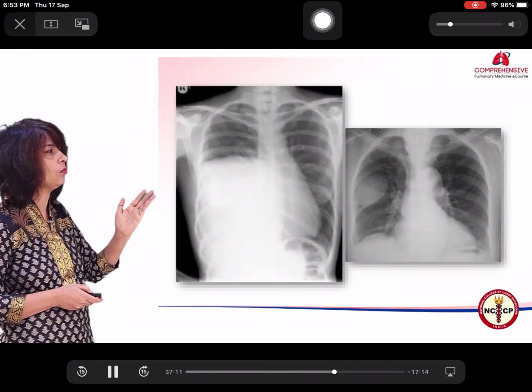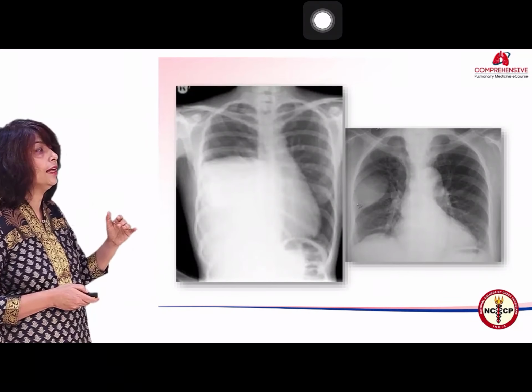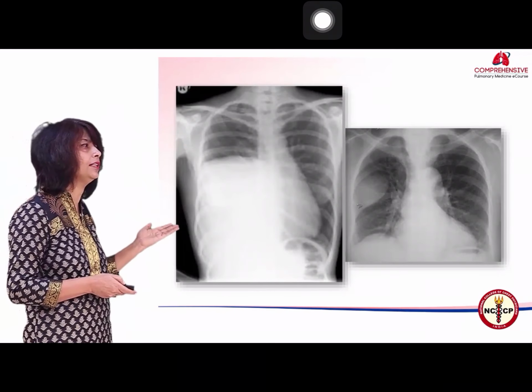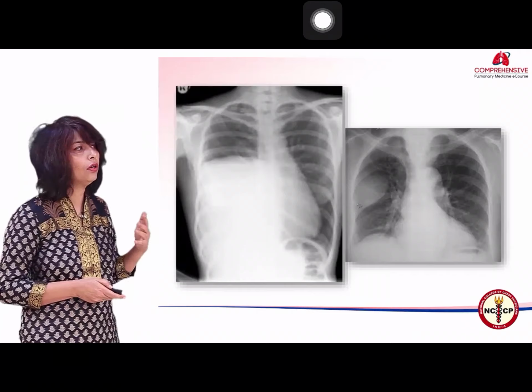In the chest wall versus pleura. I told you if I see a single rib destruction suggestive of a mass, osteomyelitis, then there is no part of this mass which is bulging in the lateral chest wall. Yeah, the muscles of the lateral chest wall are looking absolutely neat and clean. So I am most likely dealing with a pleural effusion or a pleural mass.